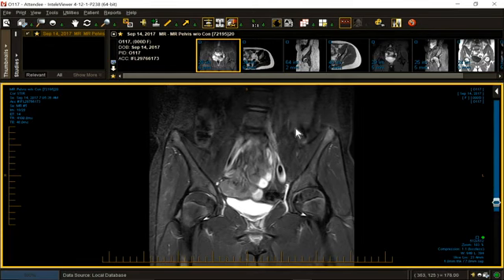I'll make this one quick. Another cross-country runner. It's an epidemic of cross-country runners. Left anterolateral sided pain superior to the left iliac crest. Rule out sports hernia.